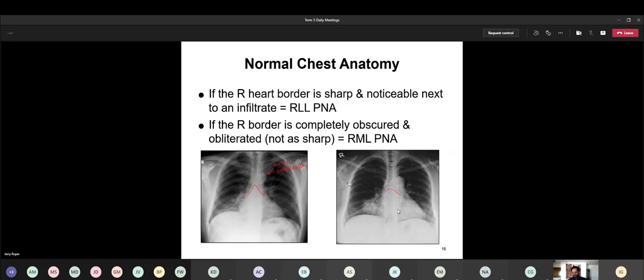But a lot of times with these sample pictures that I find, things get cut off. So it may be up there somewhere written that this is an AP film, or maybe on this side. But if you had a real X-ray that you were looking at, with the PACS system, everything digital, you can manipulate that image and move it around as you need to get a better view of everything. So in other words, it's cropped out right now, but then you could readjust and resize the image as you need to, zoom in, zoom out, and that sort of thing.